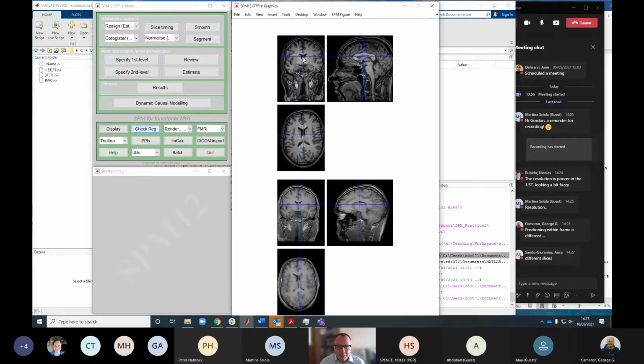So come down a little bit. Let's see if I can find a good picture. So if we look at the top one, and sort of imagine that size, I'll try to find the same approximate location in the 1.5 Tesla scan. Let me see, it's probably about there somewhere.